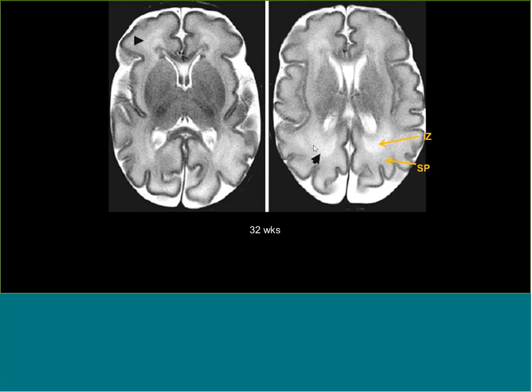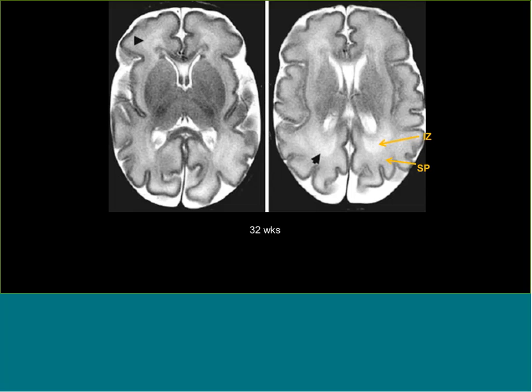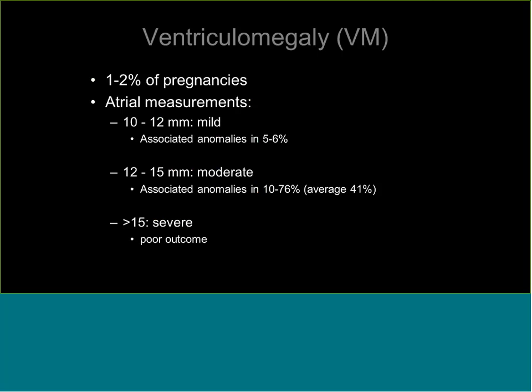For a while, people in the literature would describe that as areas of diffuse excessive signal intensity, and they thought that this was a marker of white matter injury, and it turns out that it's basically all normal. Especially if you have preemie newborns, it's all fairly striking. So that's good to know about. And this, again, disappears in the first few weeks after birth. So even in newborns, we see that. So that's good to know about.